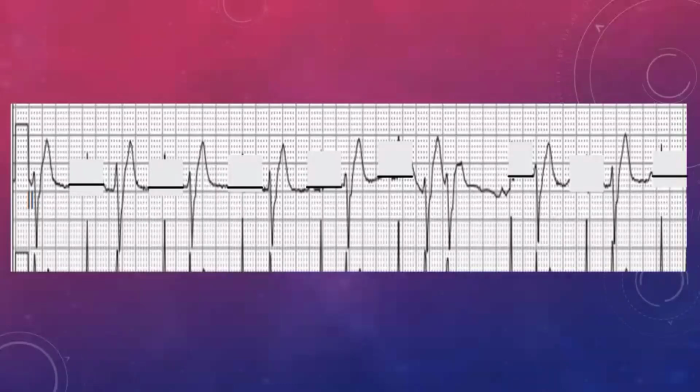But by taking a few extra minutes and looking at this, you realize that you are looking at extra ventricular beats. And so these are extra. These are not part of the normal function of the heart. So there's a few things that you could call these. You could call this an ectopic beat, or you could call this a premature ventricular contraction because it's the heart beating on its own, or it's an escape beat. There's a few names that can be used for it.